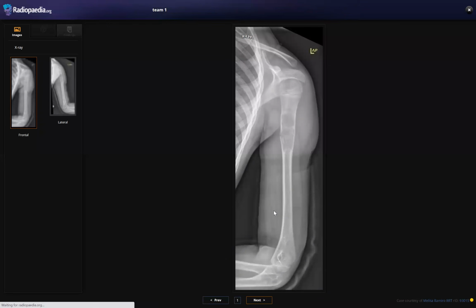I have been provided with the X-ray of the left shoulder and arm, frontal projection, of a skeletally immature patient. I can see a fairly well-defined lucent lesion in the proximal metadiaphysis of the left humerus, and it shows a narrow zone of transition. I can see a cortical break along the medial and lateral margin of the bone, and I can also see a bony chip within the lucency, which likely represents the fallen fragment sign.